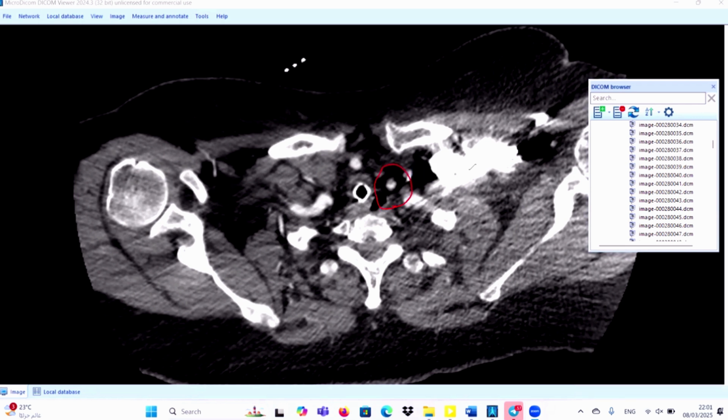But let us think again, what is the explanation for this stenotic lesion? Maybe there is something like beam hardening artifacts. If you concentrate on the image again, you will find something like beam hardening artifacts, maybe secondary to the condensed injected contrast medium along the left subclavian vein, making us misdiagnose this as a stenotic lesion. How can we solve this challenge?